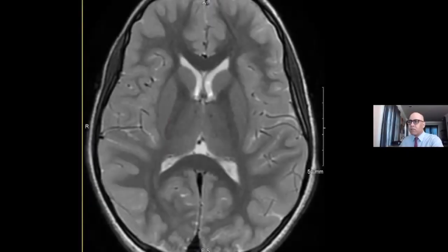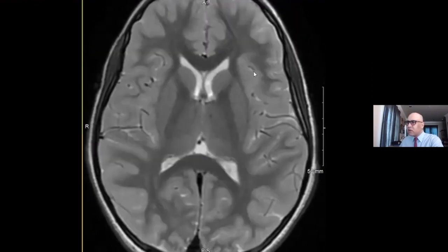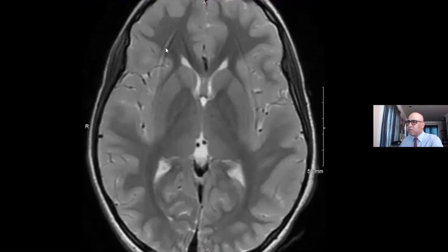This is an MRI of the brain in an 8-year-old female that was performed for headaches. And at first glance, all the major things that we look for are normal. The ventricles are normal in size. We're not seeing any mass. Now, notice you can see some movement artifact on this. This is very common in children, especially at around the 8-year age. Younger than that, we often sedate patients. Older than that, they can hold still.